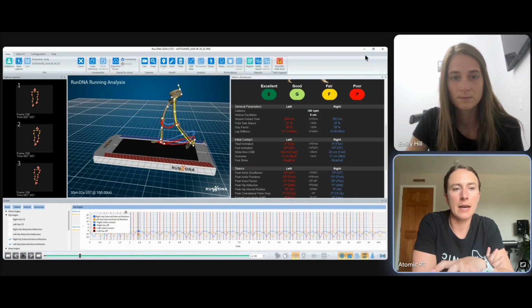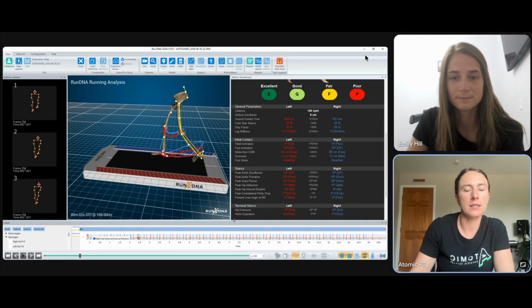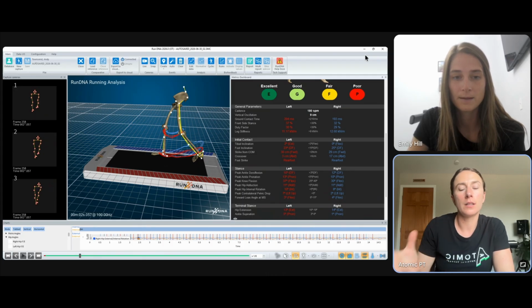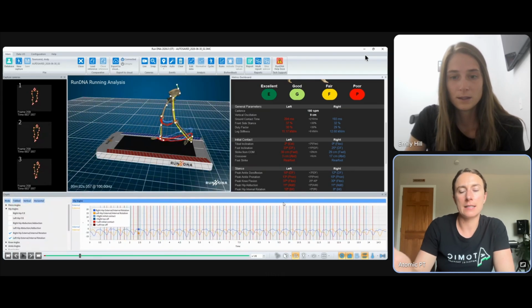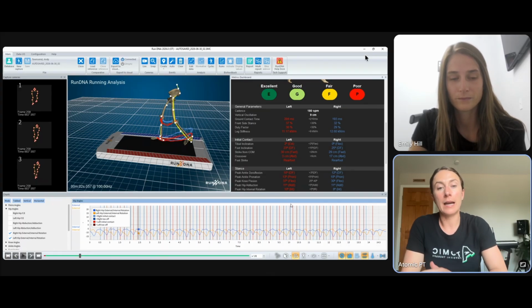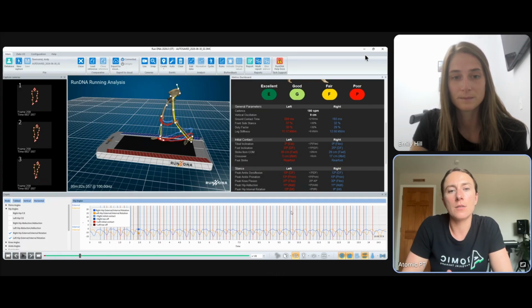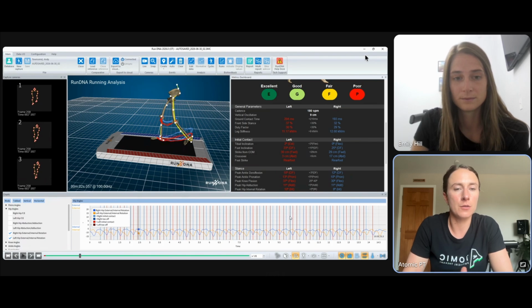Also it looks like with that you can look at it over a bit more of a period of time, whereas the data that you just explained is like the cumulative of all of the analyses. But this is like, okay, frame by frame, step by step, we can see, are there really obvious points, or is it consistently just that the left doesn't go as far, or goes further. So that's also very nice, that you can really hone it in a little bit more specifically than just whatever the data gives you from a summary perspective.